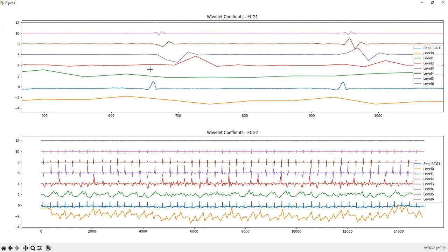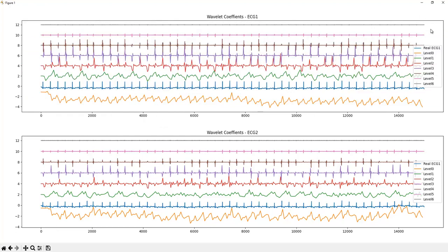And so we can easily restore. We can easily take this pattern to examine with this code like this one, because in this case we had some peak value. Look, this is the peak values. The pink signal represents the QRS signal in here, right? We can easily analyze that. We can catch that by using this transform. Okay? This is the advantage of the wavelet transform to obtain the instantaneous characteristics.